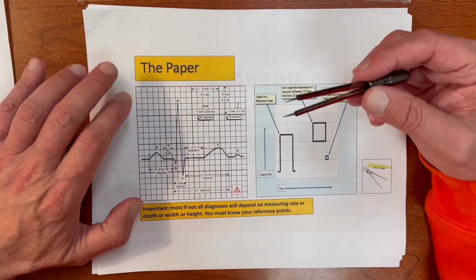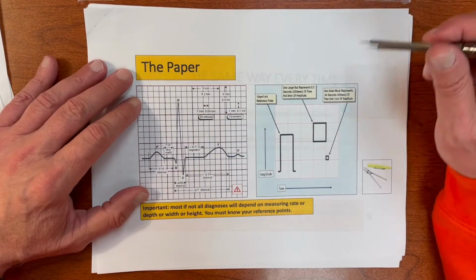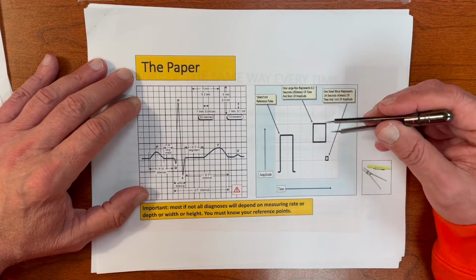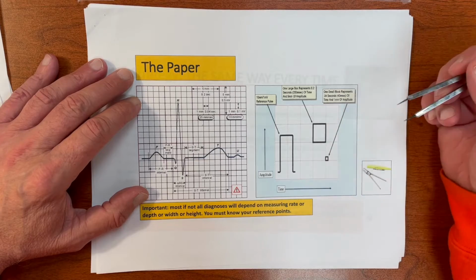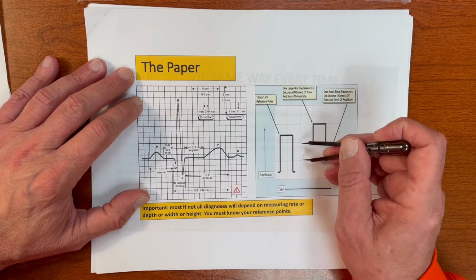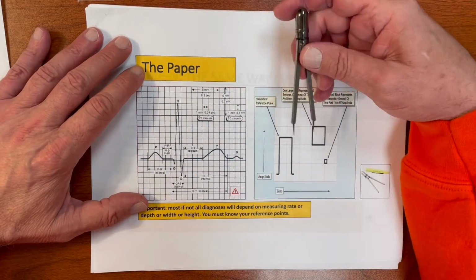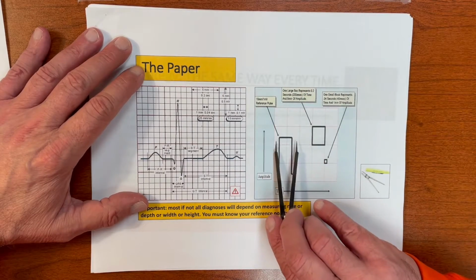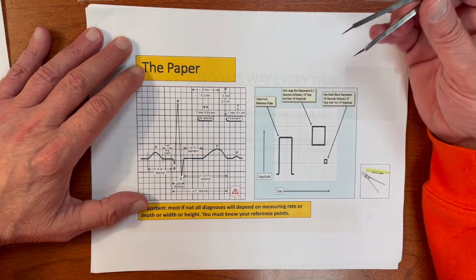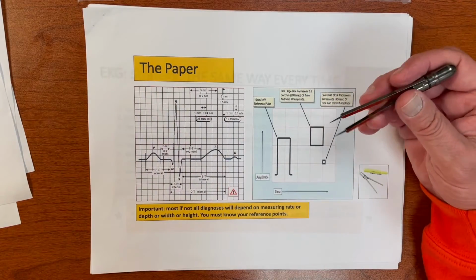Okay, now notice, I got the calipers over here, and this is where it gets very important. We're going to be measuring from here on out. We have large boxes here outlined in black. We have small boxes. We're going to be counting. When we talk about voltage, we're going to use our calipers like this. Let's say the calipers start out like this. By the way, use your calipers overhand. Don't do this, okay? It's very hard. You can't see over your knuckles. So get used to doing it like this, and you can stabilize with your thumb and use your fingers to spread or contract them.